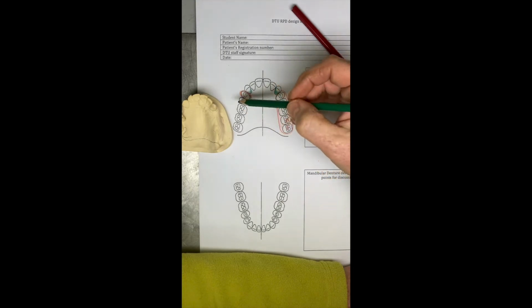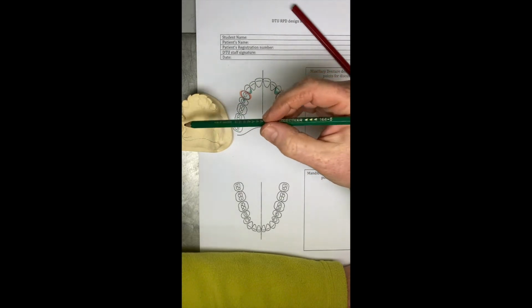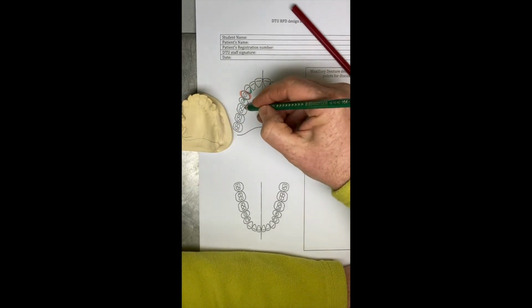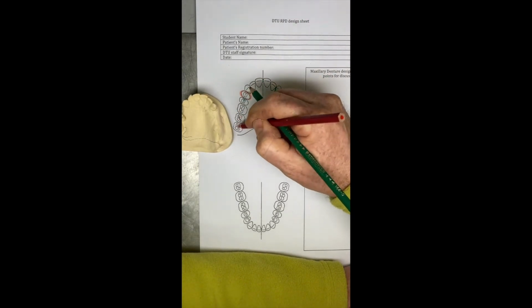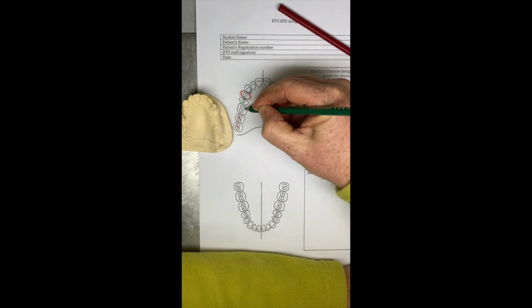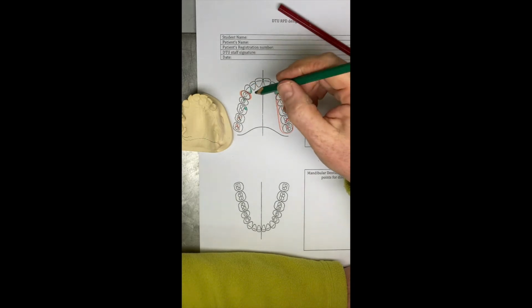and then when we look at this pattern of tooth loss, really we're going to want some support right here at the back. And we see we've got this 7 which is quite rotated. It might be an idea to put the occlusal rest here on the mesial aspect where it's easy to access. So I'm going to cross these 2 teeth out and suggest on the diagram that this one's a 6, just to make the diagram simple. And the occlusal rest is going to sit about there, isn't it? This is a case where you'd probably want to draw the design on the model.